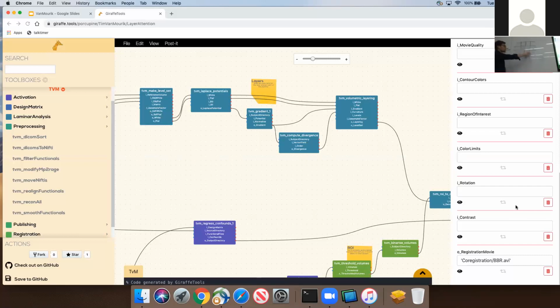Now, in this case, I've got three different layers, and on top of that, I've got a CSF layer and a white matter layer, and that basically gives me a column of, let's call it, a beta. We're just going to use beta weights in the same way as you know them from temporal regressions. And there is a white matter signal.